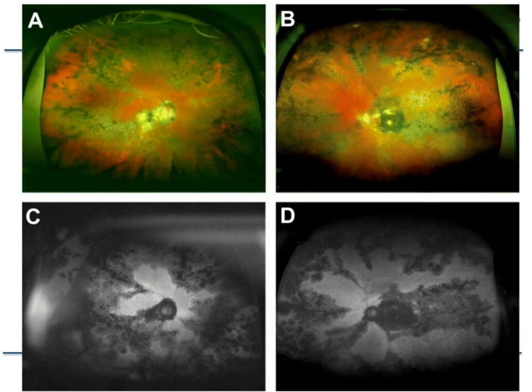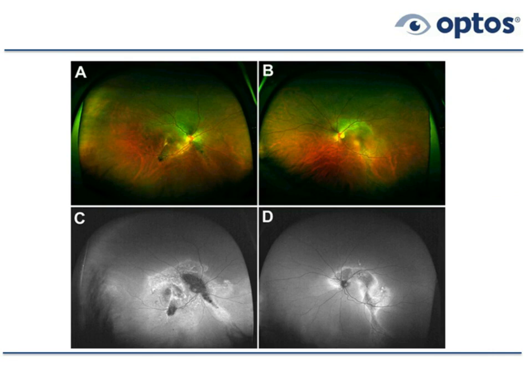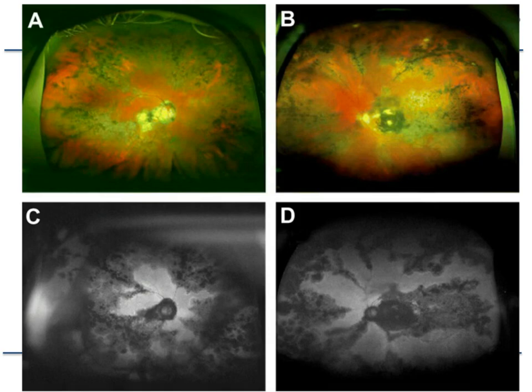Does that matter? Well, it really does, because these patients, when they have active retinitis, should be treated with typically systemic steroids or possibly steroid injections into the vitreous. So the case we were looking at first really should be treated. In the second case, everything looks like it's under control. There's nothing active, so it shouldn't be treated. So autofluorescence can be very, very useful to tell us the difference between active and inactive lesions.